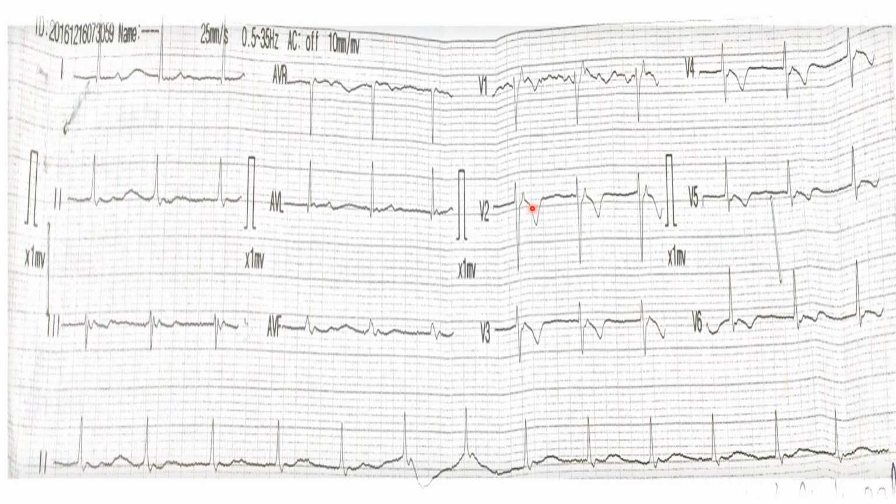This is a very important concept that needs to be brought to mind when considering the diagnosis, as definitely the management might vary depending upon the diagnosis. This sometimes baffles some of the clinicians who are not used to seeing these types of ECGs. So for that purpose, let me make the concept clear in your minds regarding the difference between sinus node dysfunction and AV blocks on the ECG.